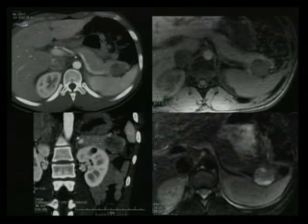Depending on the component, you can see, like in this case, on MRI, which is very good for identification of necrotic or cystic changes, how the lesion is mixed with a solid center and peripheral areas of cystic degeneration. It's a different pattern: more rounded, more defined, completely different from the adenocarcinoma.